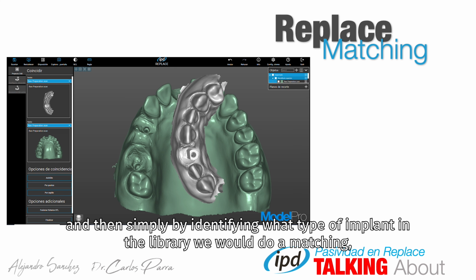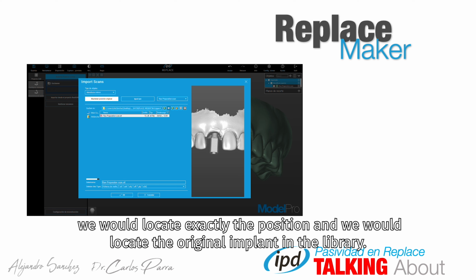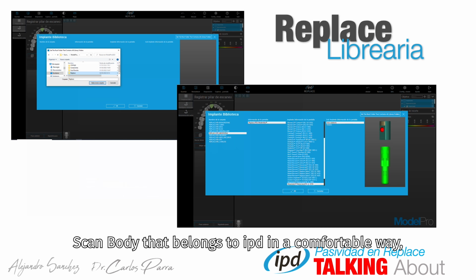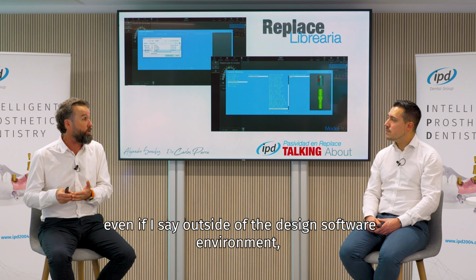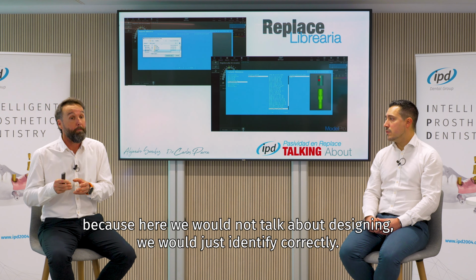And then simply by identifying what type of implant in the library, we would do a matching, we would locate exactly the position, and we would locate the original implant in the library. And we would locate the original implant that is in the mouth with the correct scan body that belongs to IPD in a comfortable way. Even outside of the design software environment, because here we would not talk about designing, we would just identify correctly.